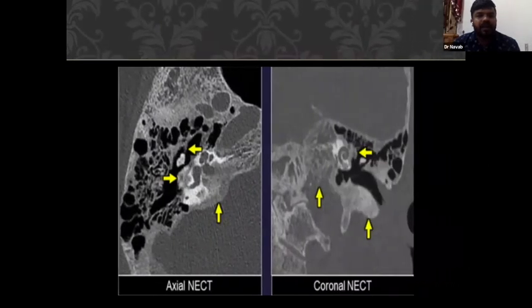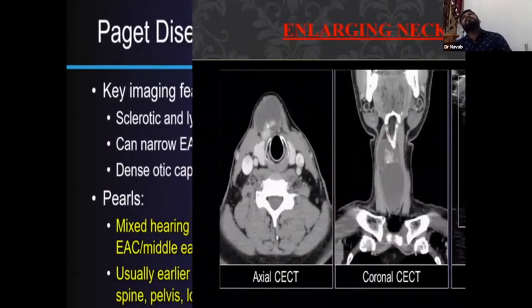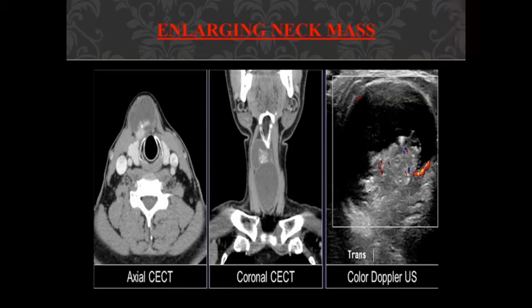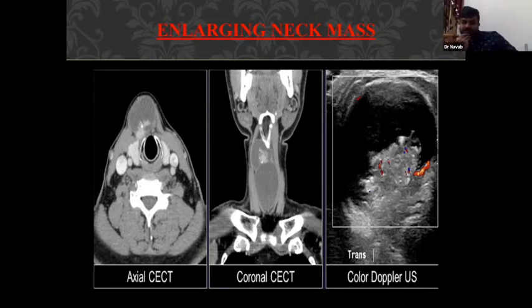So, this is a very simple case. Tell me what is your diagnosis? Is there any suspicious feature? Cyst with malignant transformation. Why are you saying malignant transformation? There is a papillary growth with internal vascularity. Okay. But that can also be due to prior infection.